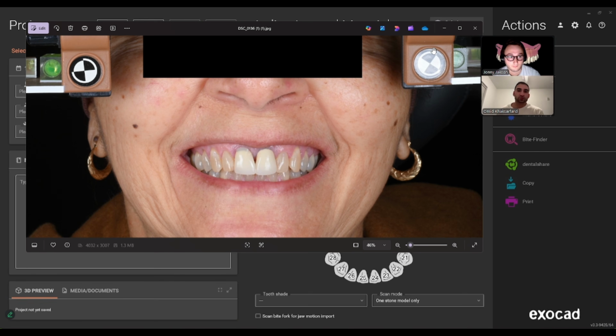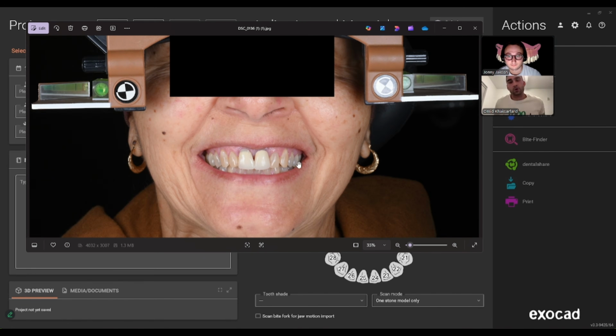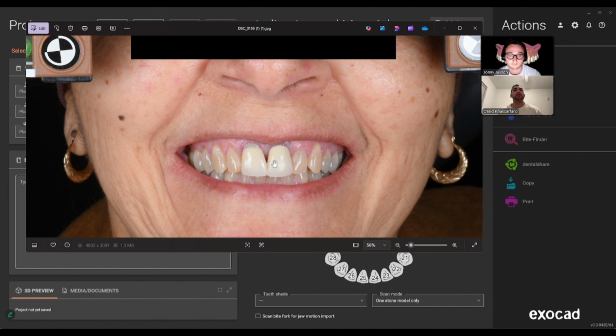So, Johnny and I worked on a whole mock-up with the AI feature that he's going to be describing in this video. Overnight, with some time spent together over a Zoom session, we made a mock-up, we printed out the entire presentation, and I presented it to her. After that discussion, when she saw the end result of where she can be with a brand new design, brand new of what she would like, that was it. We were rocking and rolling after that appointment. So I really think this tool helps the patients understand.